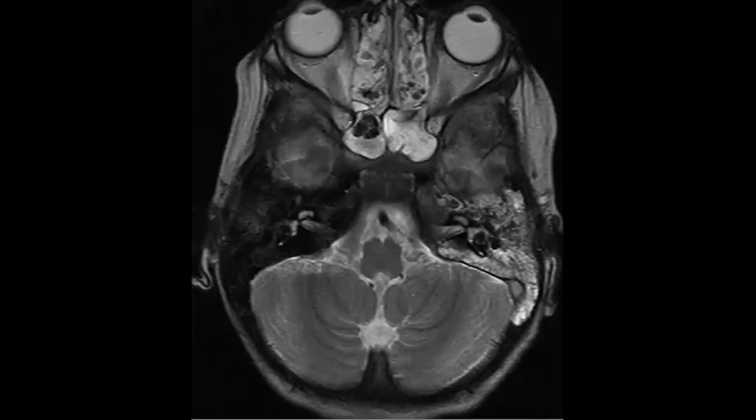Nice. A good thinking from you. Huda, nice. So already you can see the mastoid air cells have altered, abnormal signals, high signal in T2. And also you can see the sinusitis already in the ethmoidal and the sphenoid sinus. So this patient has sinusitis and mastoiditis.